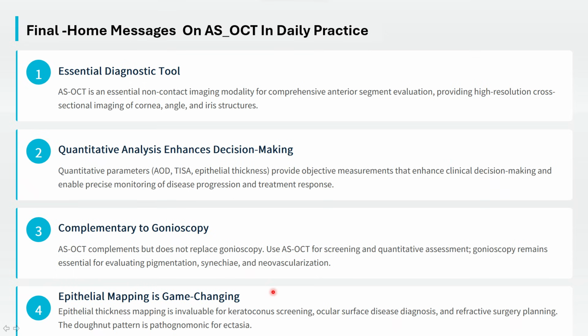So this is the importance of the anterior segment OCT, and we have seen all the possible clinical applications, and there are still a lot of other applications I didn't mention in this lecture, like the use in contact lens clinics, determination of the gap or the tear film interface between the contact lens and the eye, also in the use of piggyback contact lenses, and many other applications that I couldn't include in this lecture, as I don't want the lecture to be very long for you.